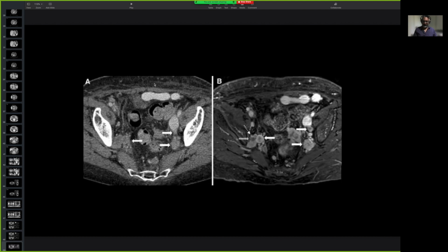All right, let's keep going. What level? Again in the pelvis. Posteriorly, that's like the sacrum. And so you got nodes in this area. So these are inferior rectal nodes or mesorectal nodes around the rectum. Oh, sorry, you're right. Internal iliac nodes. That's also fair because the internal iliac artery is in this area exactly. So yep, internal iliac nodes is actually more correct for this.